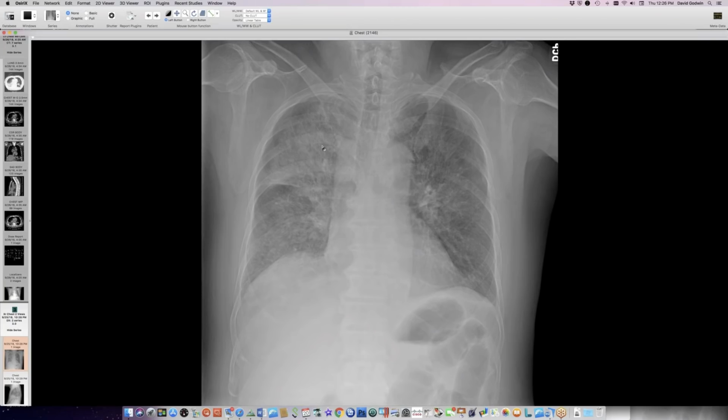It does a variety of things, but most of the cases I've seen have been diffuse and low grade like this, with mostly a ground glass abnormality. And that's a common presentation of Legionella. I'm not sure how to explain the pleural effusions. I don't know whether he'd had hydration to cause those or what.